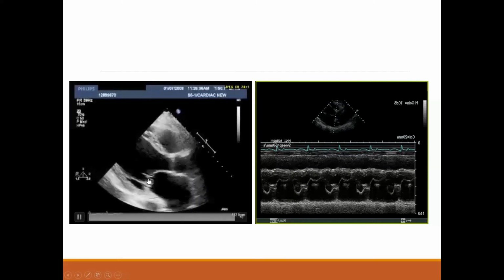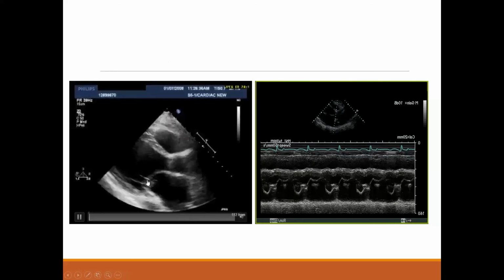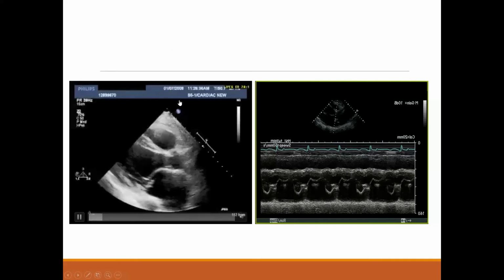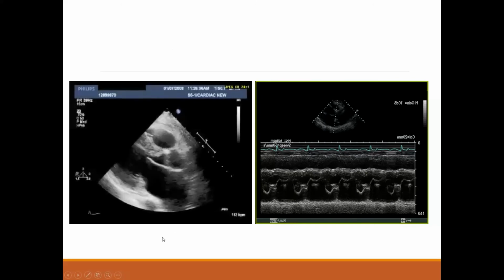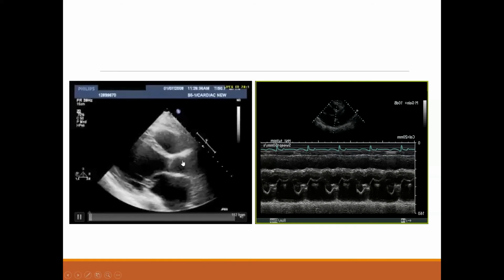And what is the direction of the jet expected to be? Anteriorly directed. So if you are going to examine this patient with a stethoscope, you have to go anteriorly. You trace the radiation of the murmur anteriorly across the sternum up toward the aortic area. If you go toward the axilla, you are not going to find it. It goes toward the axilla if it's central or posteriorly directed. But if it's anteriorly directed, it goes toward the aorta here. That's the aorta, so you put your stethoscope where the aorta is. So you go up.